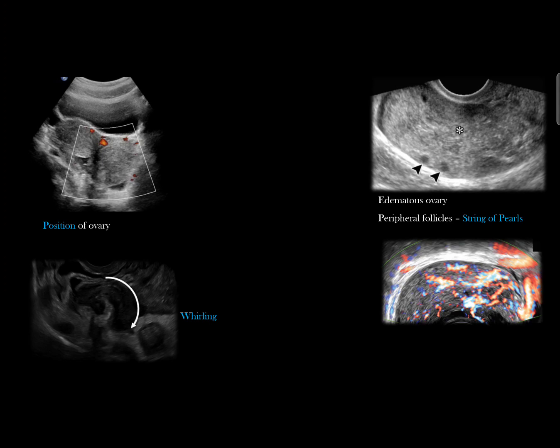In ovarian torsion, oftentimes people look out for the presence of vascularity. However, this is not a reliable sign because in the initial phases, it is only the venous flow which gets compromised. Even at times, the venous flow may also be patent. So, in the initial phases, we might see a high resistance flow in the arterial system, but there might be variability in the arterial flow pattern as encountered with the various phases of the menstrual cycle.